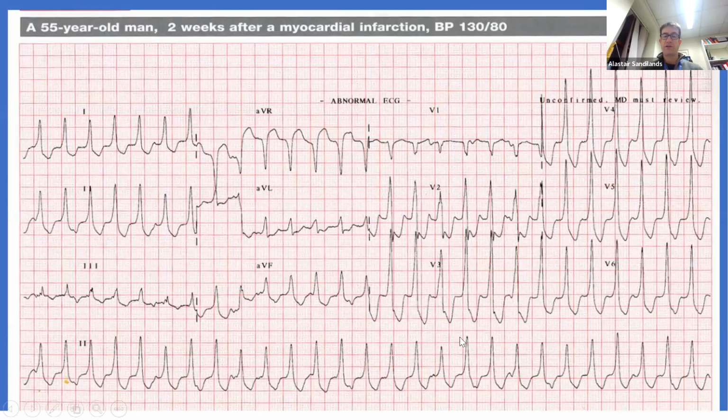Okay, another example. So we have a tachycardia. Is it narrow or broad? It's broad. QRS is broad. Is this a typical bundle branch block pattern? Could be left. It's a bit small for left bundle branch block, but let's check. No, it's very positive in V2 already. So the axis is not left. So this is definitely not a left or right bundle branch block pattern.